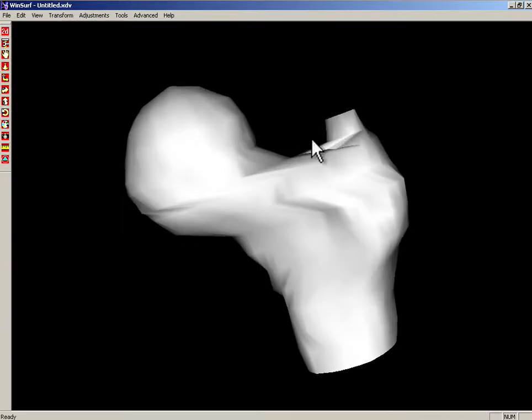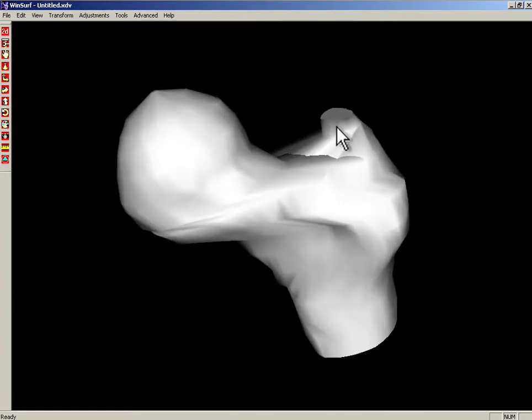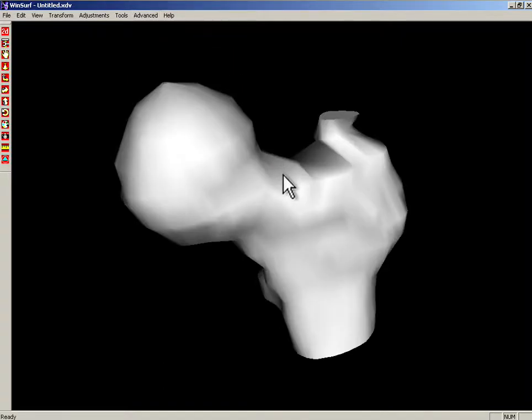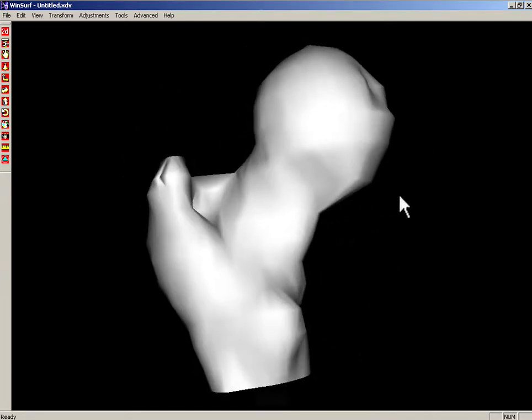I have, and you see it's not perfect. You have a mistake. You have some artifacts. So in this kind of shape, which has 2 layers, you should better use advanced surfacing. If you do that, you will have a more regular shape, which is not perfect here, but which is not too bad, you see here.